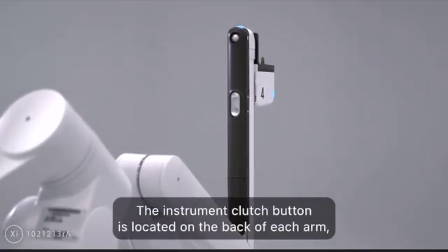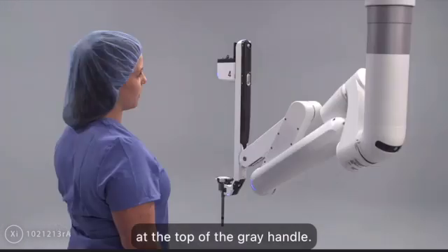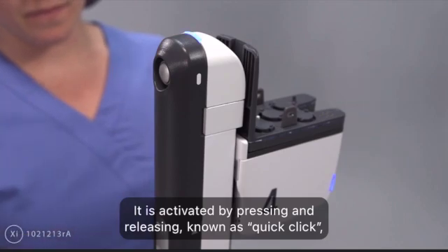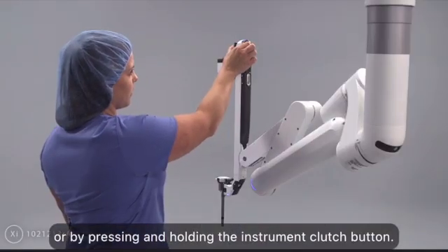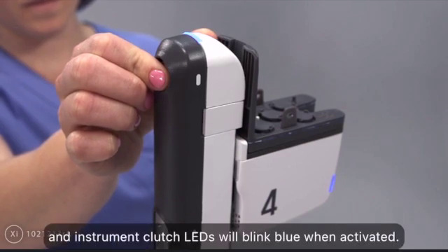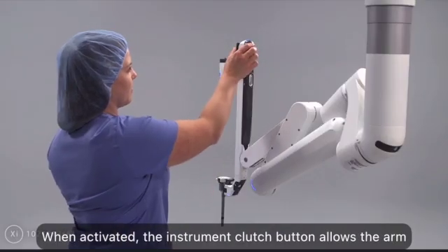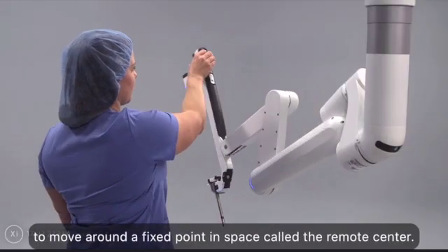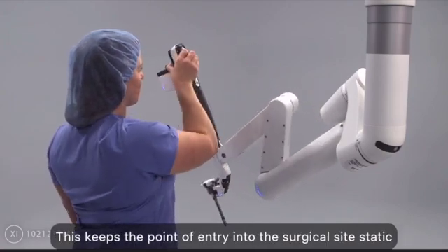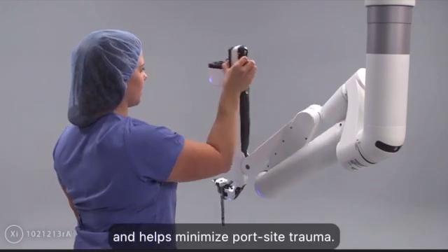The instrument clutch button is located on the back of each arm at the top of the gray handle. It is activated by pressing and releasing, known as quick click, or by pressing and holding the instrument clutch button. Instrument carriage LEDs and instrument clutch LEDs will blink blue when activated. When activated, the instrument clutch button allows the arm to move around a fixed point in space called the remote center. This keeps the point of entry into the surgical site static and helps minimize port site trauma.